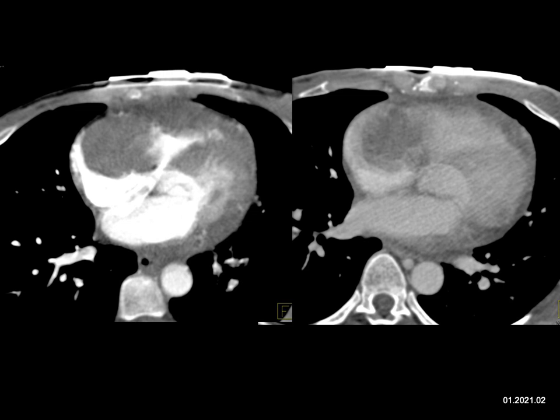Metastases are about 40 times more common than primary tumors. Renal cells are usually vascular, but they don't need to be, but that's a good possibility. Then the last thought is atrial myxoma. Now, myxomas are tumors that occur in the heart, of course, most common in the left atrium, second most common right atrium. But this is the patient's right ventricle.